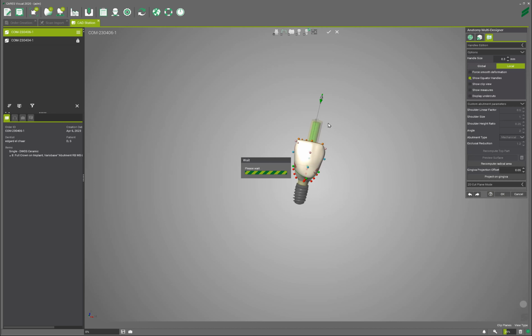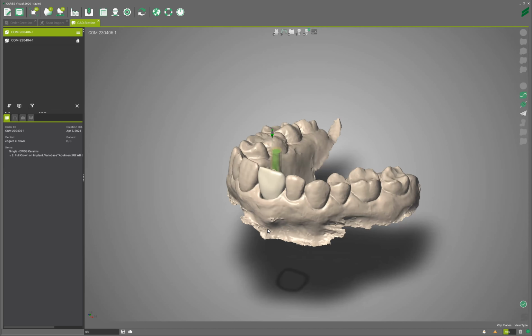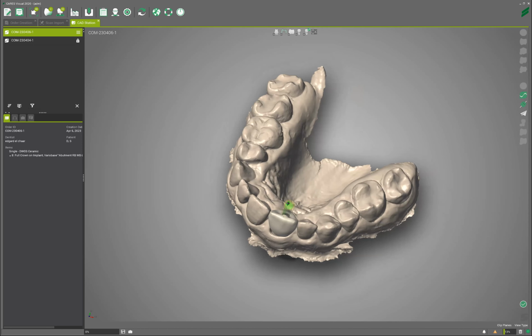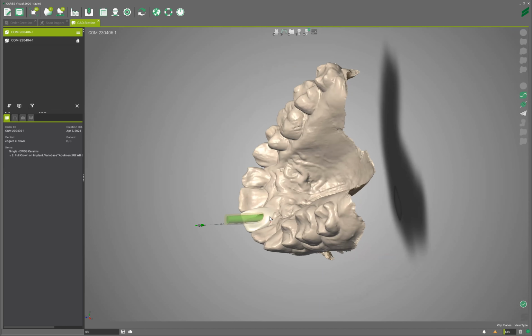Okay, now it's very important that I remarry everything together. And there you go. And then I'm going to take a look and look at it. It made it open in here. So that's fine. And I can go back now to the crown.